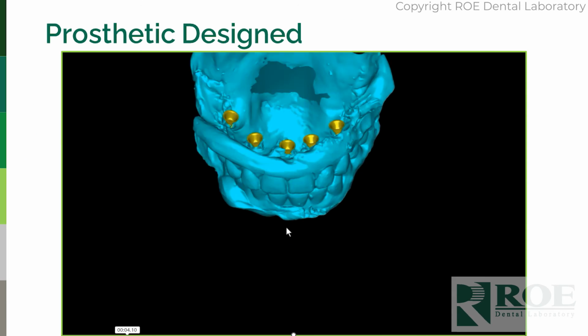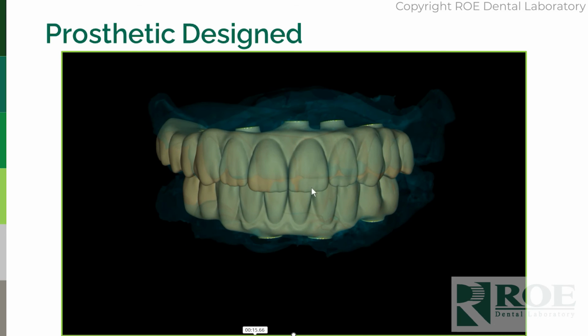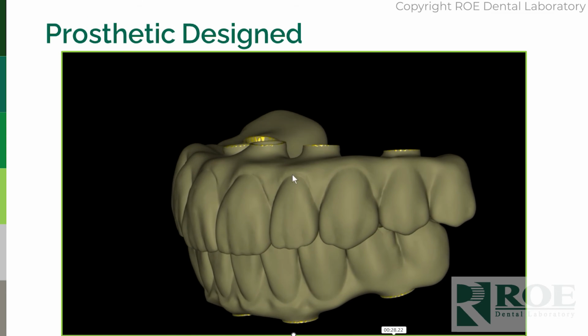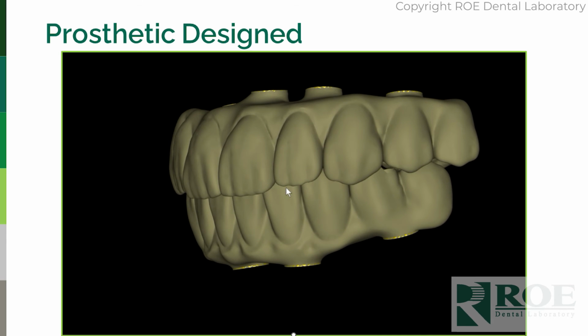All right, here are the records based on that, and those copings are just for visuals, just to show you how we have aligned the parts, and then we design your prosthesis, ship it to you to print. There are no copings, that's just a nice little pretty visual. Coping free. Or, as we mentioned before, make some models and make copings. No problem. Totally up to you.